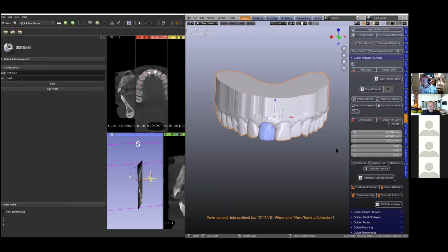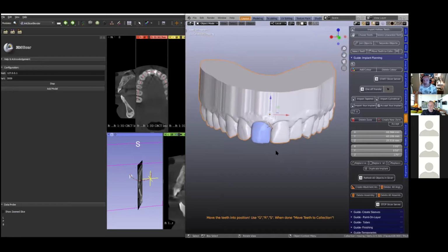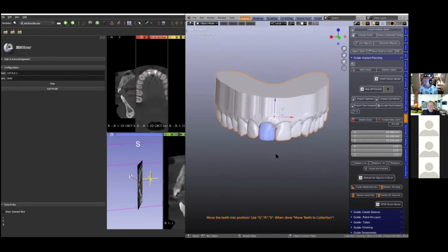And we don't want the STL files of a model or a dense ICP model to go here and back and then back, because it's going to take a long time and you may think it's stuck. We've had a user the other day, they tried to do that, but their tooth library was so dense that it struggled flicking it to the other side and back. So we just changed that, and then it worked.